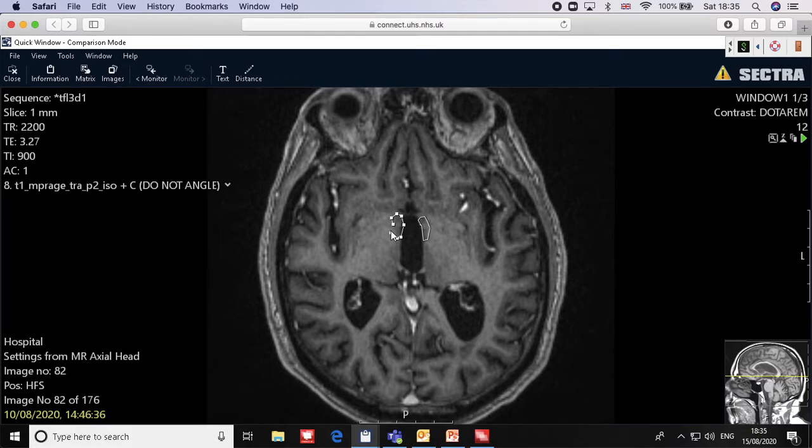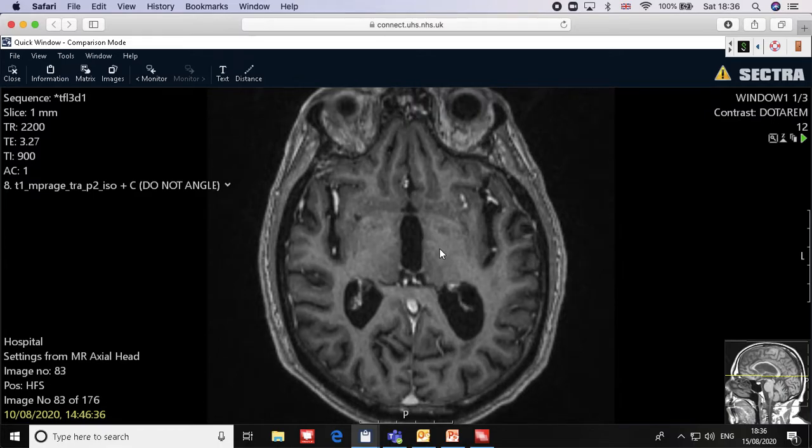That's why when I was doing it on the CT scan, I didn't know how far posteriorly to go. But if you have an MRI for the same patient, this is not the same patient, by the way, you can see the gray matter and adjust it. You can say, okay, I will go posteriorly something like 7 mm to 8 mm, and localize it like that. Then interpolate between the slides. This will give you the two structures in the coronal view.